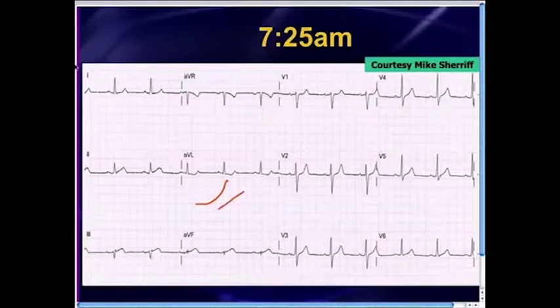We've talked about that on the EKG series, a weekly series as well. When T waves start looking very straight, it's oftentimes an early marker of ischemia. So combining that AVL abnormality, the reciprocal changes in AVL, plus the straightening on the initial part of those T waves, Mike was right here able to diagnose an inferior wall STEMI, or confirm an inferior wall STEMI. The EKG machine, by the way, still is not calling this STEMI, so he diverted the patient to a cath center instead of a non-cath center, and then when they got there, they repeated another 12-lead EKG.